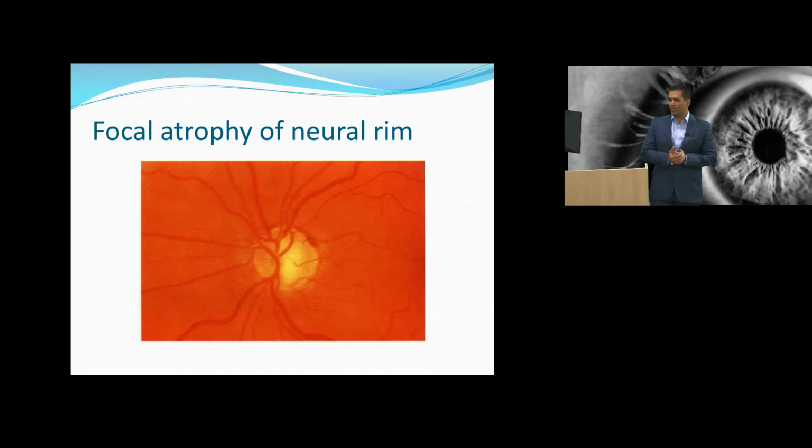In the absence of the most ideal way, or if there are not many capillaries, we use any cues in 3D. You can actually identify if there is a dip. That's usually very helpful when you use a slit lamp BIO and look carefully. Color is the least desirable method of identifying where the optic nerve head cupping ends. Color can be quite misleading given the camera picture that has acquired it. But here we have a two-dimensional picture. That's all we have. We don't have the patient.